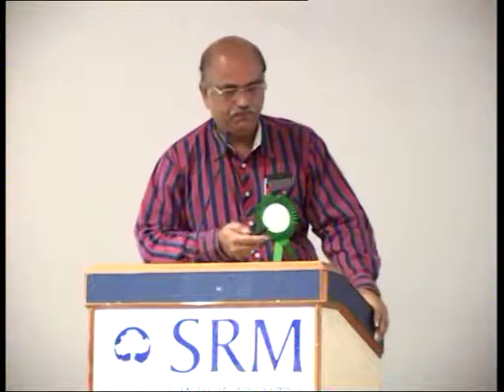This is the same technology that we have been using in ultrasound when you are seeing all the organs. The same principle we are using, and this is the same principle used in naval technology. When something has fallen into the sea, how do the Navy people find out where exactly it is? They will send the ultrasound impulse and measure how deep it is. Then they will calculate how much time it will take to go and reach it. So the technology used in naval work is the same technology we are using here, and we are measuring the flow.